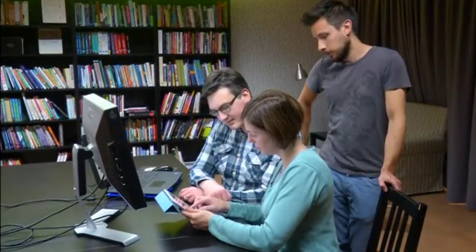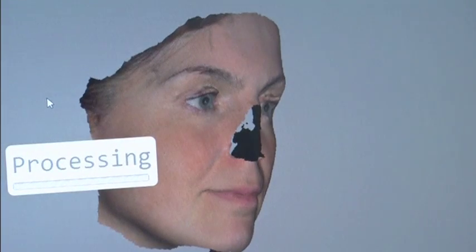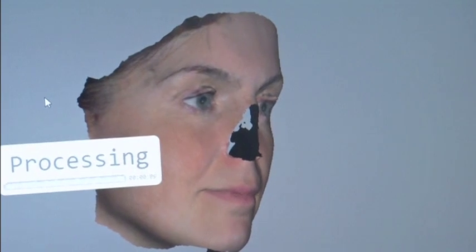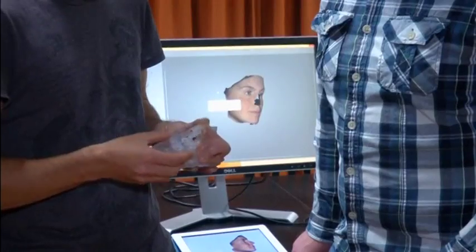Yeah. It's actually just a view on information of what the texture would be from the surrounding area. But you see, inside are the little metal pins. That's where the nose actually clicks onto. Yeah. So then it's magnetic, so it stays on very well.